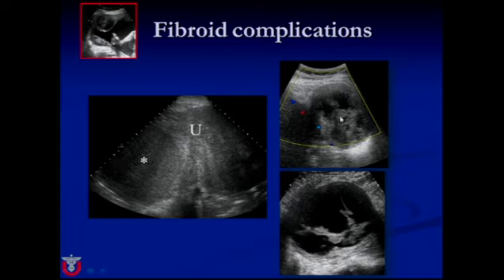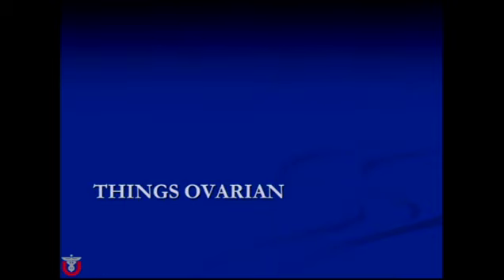This is easier than this kind of condition where you have a complex adnexal mass. If you can find an ovary separate from this, you can be comfortable that this is not an ovarian tumour. But if you can't, it can be very confusing and it's difficult to know if you have an infarcted fibroid versus perhaps ovarian torsion with a mass. And in those circumstances, MRI can be very helpful because you can identify a normal ovary based on the follicles, and you can show that these lesions extend out of the myometrium and are indeed fibroid in origin.